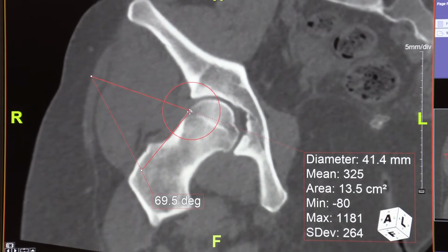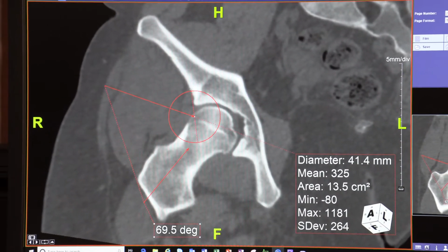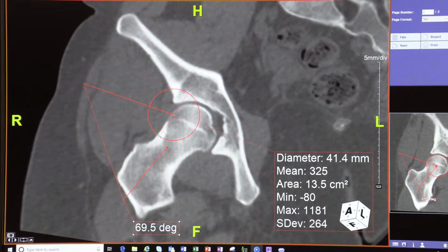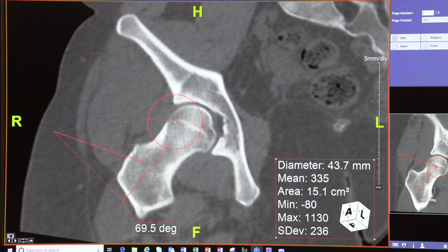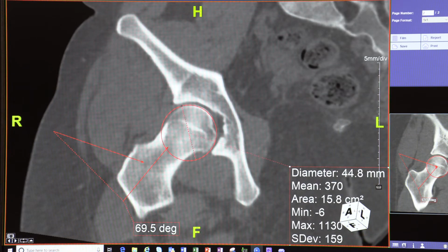And then again, move the lines and move the circle if it gives me an option. Actually, it's not giving the option. Moved a little bit. That's another line. Okay, I can redraw it if it doesn't give me the option. You can always do that. Bring the circle there. Now it's giving that.